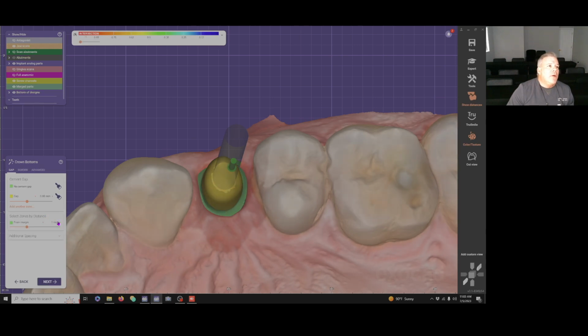the crown now. So you want to check your parameters over here, your cement spaces, because we didn't adjust anything in the job description section. It's got a little extra space around it. Cement margin, that all looks good. The borders, these are the borders that I do not prefer. I'm gonna just shrink them up a little bit. That looks good.